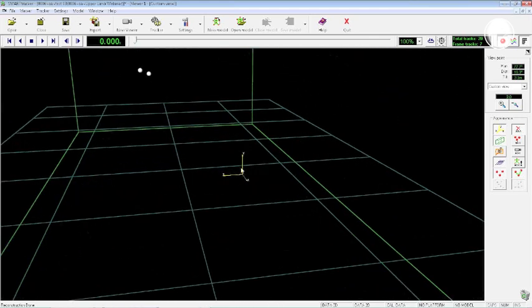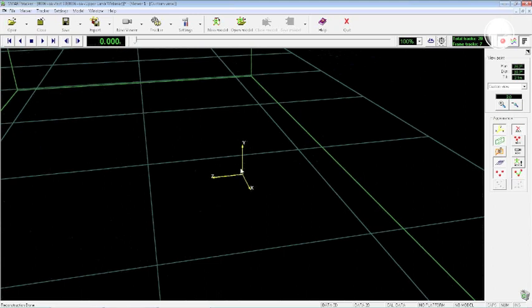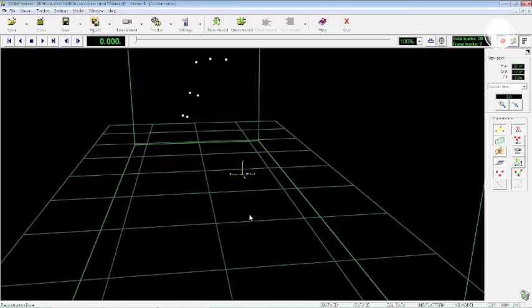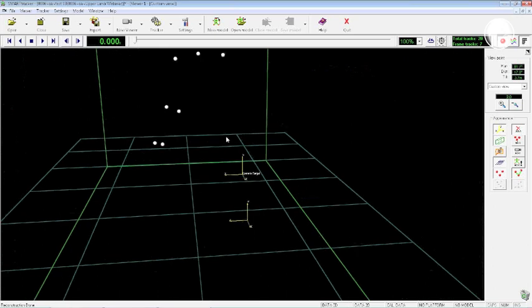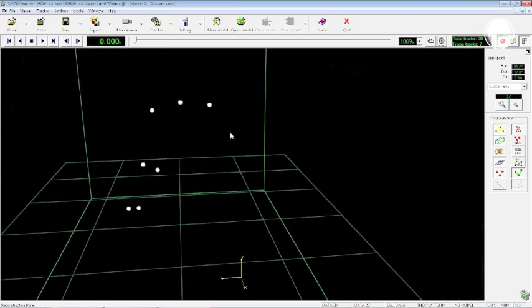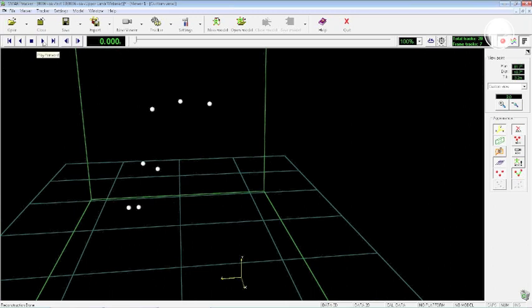Here, if we get closer and we zoom in, we can see the reference of the lab, so X, Y, and Z. And here the markers. As you can see, we placed 7 markers over the subject, and in particular, I can show you the movement by clicking on play. This is the left acromion, C7, right acromion, the 2 condylus of the elbow and the 2 condylus of the wrist.